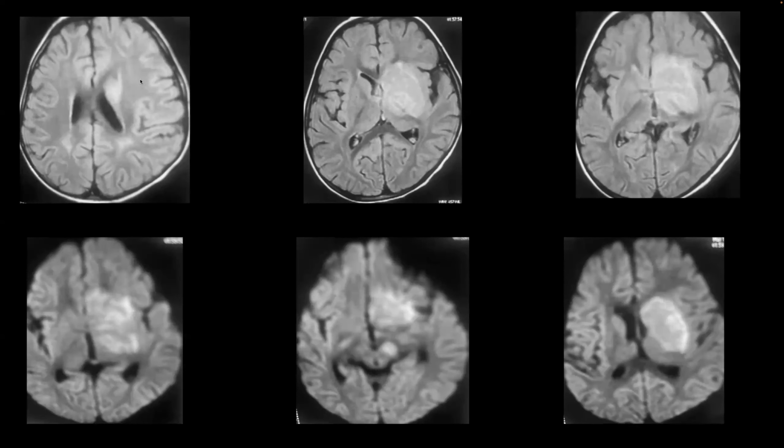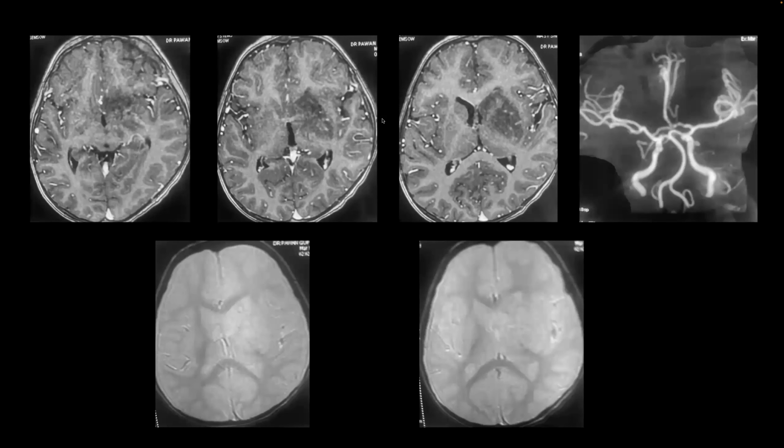So predominantly left basal ganglia thalamic changes, also the periventricular white matter, subinsular white matter, with corresponding restricted diffusion, also extending down up to the ipsilateral peduncle, subthalamic nuclei over there. So predominantly edematous deep brain nuclear structures on the left side, causing some compression of the lateral ventricle. Post contrast, there is some linear enhancement or leptomeningeal enhancement of the structures involved in the left basal ganglia.